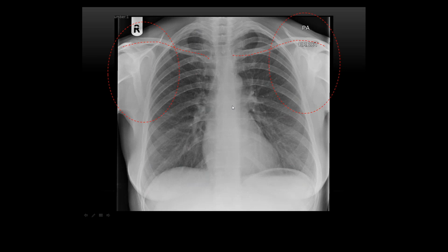No? And then finally, whilst we're on bones, you want to be looking at the shoulder girdles as well. There have been a few cases where a patient's been referred from ED following a fall, with a query pneumothorax, and they've done the X-ray and they've got a dislocated shoulder. So it's always good to look outside of the chest as well. So look at the clavicle, look at the shoulder girdle, make sure you've got your humeral joints normally aligned.